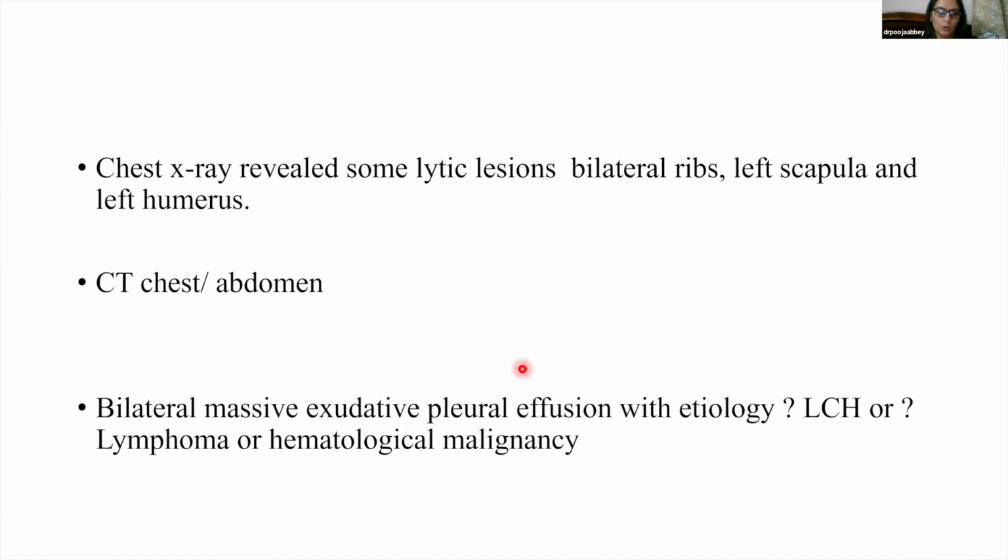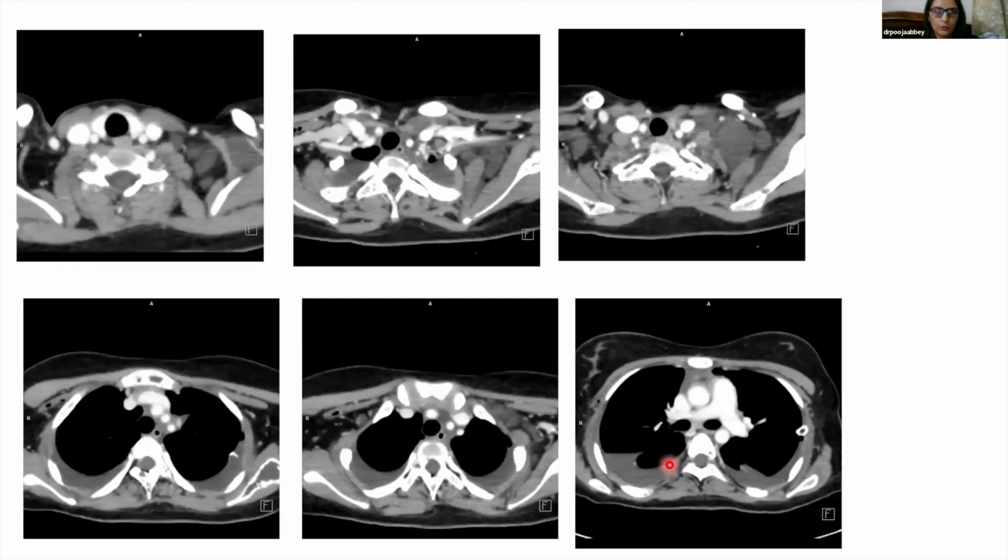And that is what was done. The working diagnosis was an exudative bilateral massive effusion and either LCH, lymphoma, or hematological malignancy. So this is the CT. The contrast enhanced CT, axial mediastinal window sections.